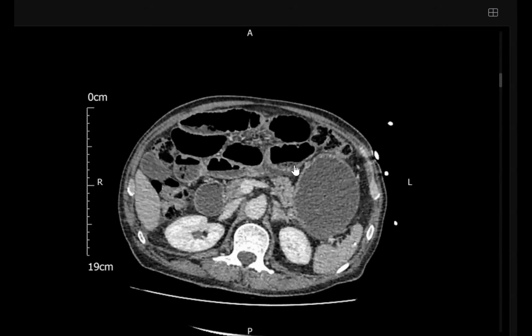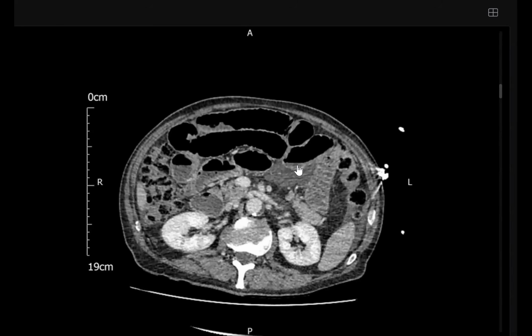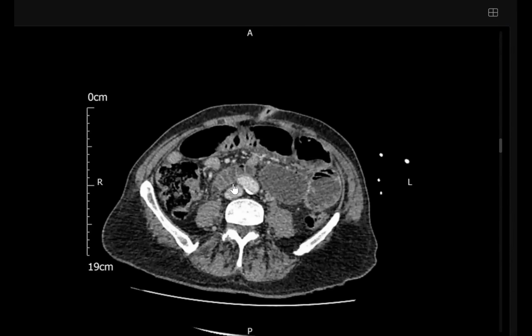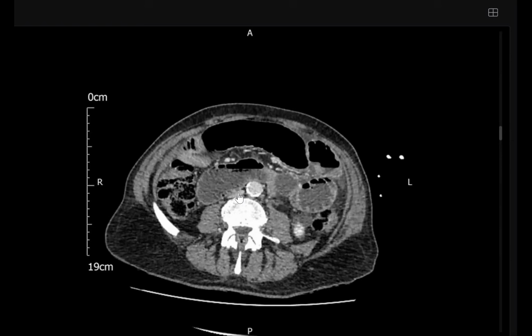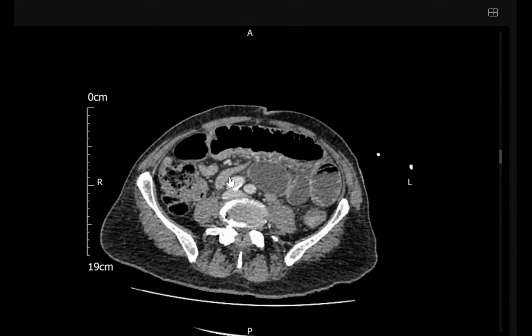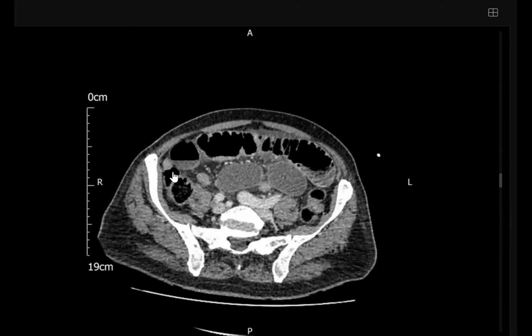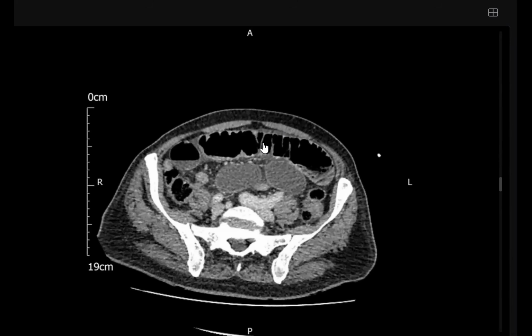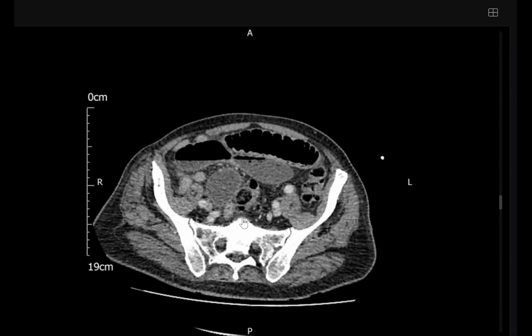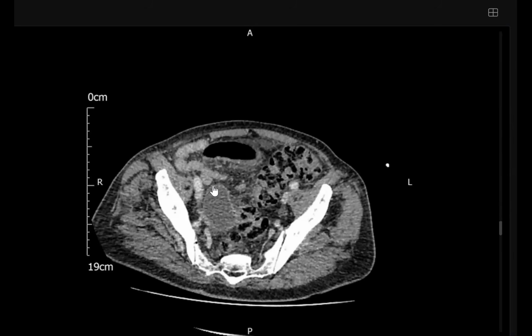bowel loops. Very good point from you. It's normal wall enhancement and normal thickness. Very good. IVC looks of average caliber. It's not shock syndrome, although compressed here, but usually, mostly of a normal caliber. Good. No free air. Yet in my routine practice, what will you do? I'll convert it to the lung window and rule out any small air. Very good. So you assess the vessels, you assess for pneumoperitoneum and no pneumatosis.